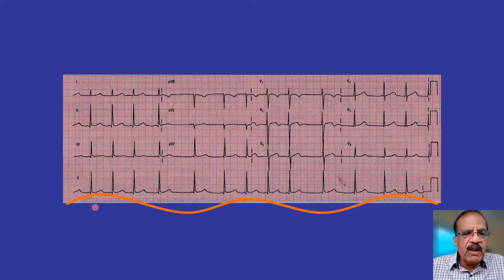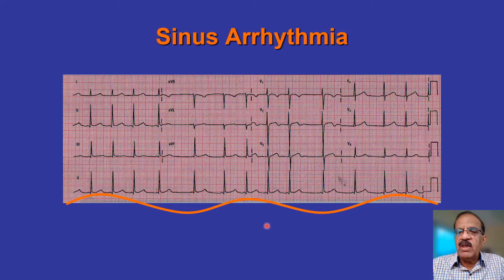And the cycle is about 16 per minute. What other cycle in the body is 16 per minute? Our respiratory cycle, approximately 15, 16 per minute. So could it be sinus arrhythmia? Heart rate getting accelerated during inspiration and decelerated during expiration? Well, that is definitely a possibility. It is actually the case.